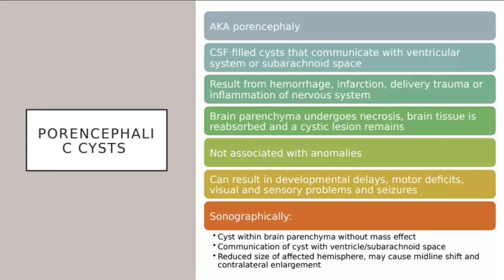And it's not a choroid plexus cyst. It's in that tissue. It's in that cerebral tissue. So okay, well, what is this? Why are we getting a cyst in that region?